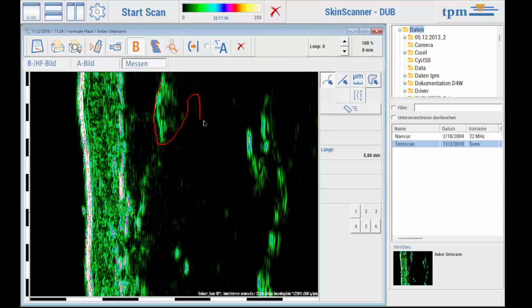If you want to measure a distance or an angle, the next icon is the right one. Again, hold the left button with the mouse and a straight line is formed. To the right of the scan, you can read both the distance and the angle degree.